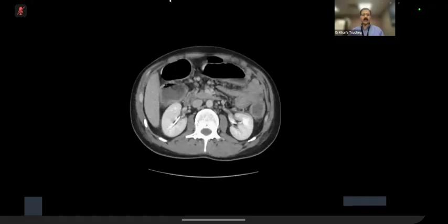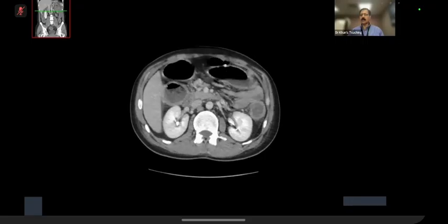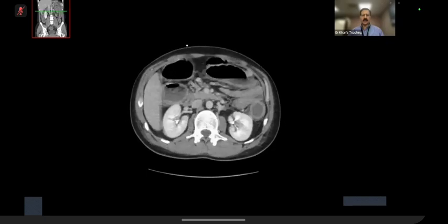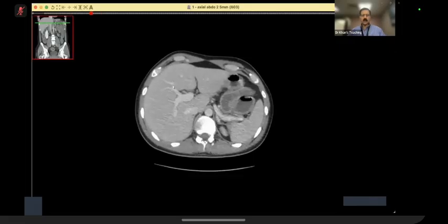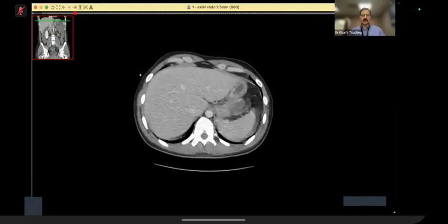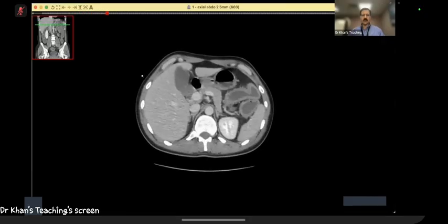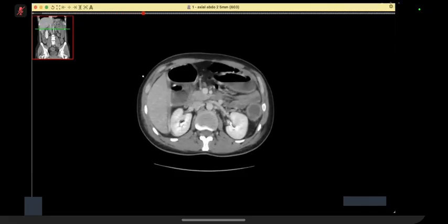You know, another method is there is a toolbar. I don't know because my screen is not projected on yours. There is a toolbar on top, and you can actually drag it. In any case, let me do it for you. Now, so I've gone to the lungs and I'm coming down. Just concentrate on bowel and don't concentrate on anything else.